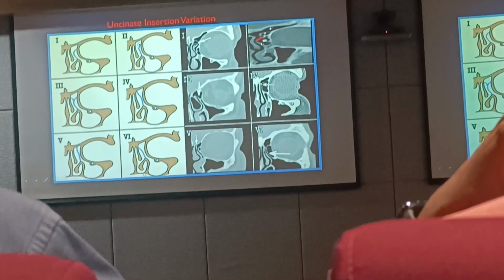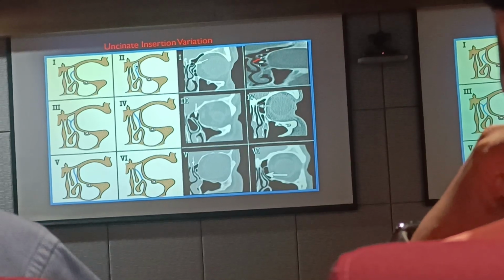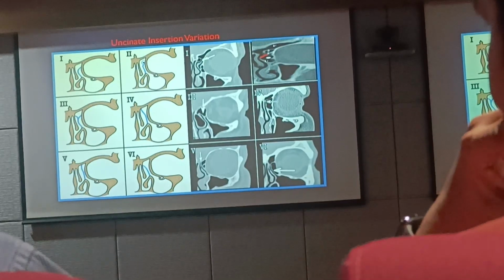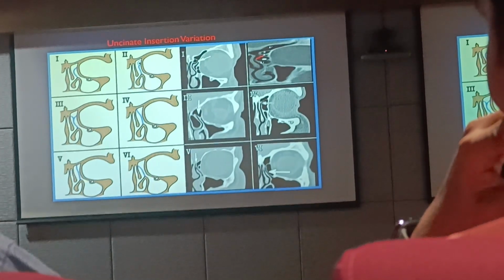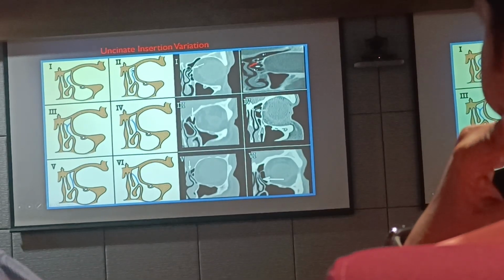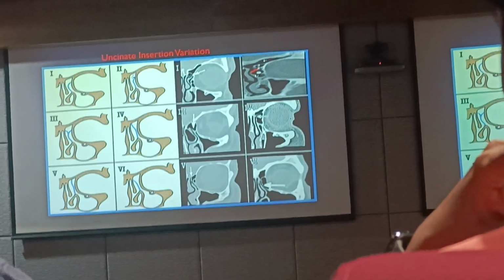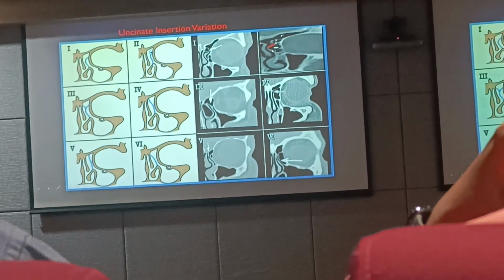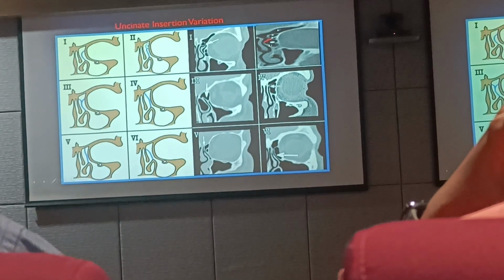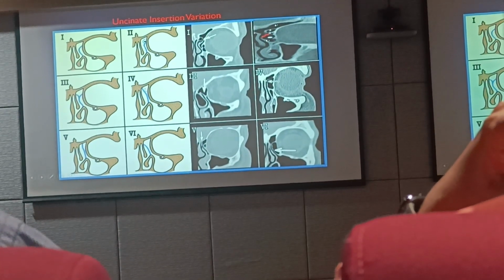Now, the frontal sinus, if you read a chapter on frontal sinus, they will always talk to you about attachments of the uncinate and the agger, and how they change the drainage pathway for the frontal. So why is the uncinate important? Because you should know how to take off this uncinate, and then you understand where your frontal recess is in relation to your uncinate attachment. For example, this is the uncinate attached here. So where will your frontal sinus open? Medial to the uncinate, correct? If the uncinate is attached here, where will your frontal sinus open?